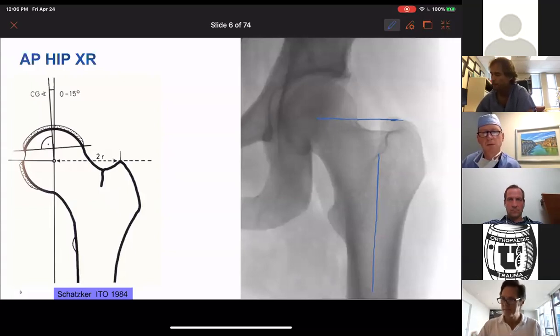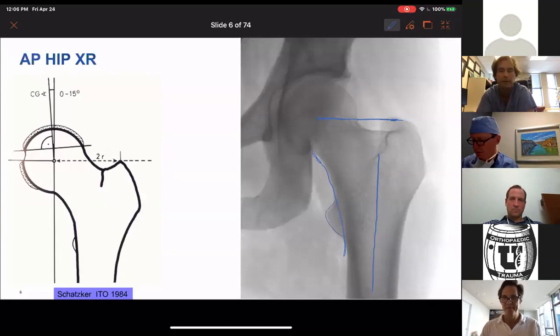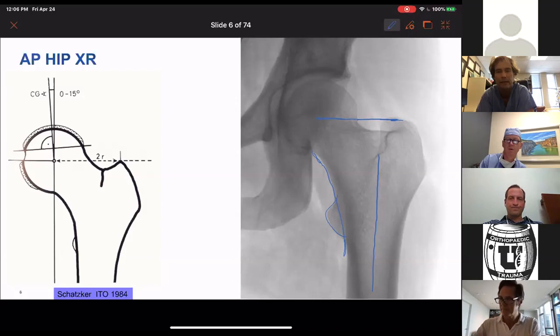Fourth, there is a particular relationship between the inferior aspect of the neck of the femur and the shaft. It is a smooth, unbroken curve. And the lesser trochanter, in varying degrees, will come out from that curve. And I say in varying degrees because there's wide variability in the population as to the size of the lesser trochanter. So in and of itself, it is not a measure of anteversion. I don't think you can use it just for that. Now, if you have a fracture of the proximal femur and it is attached to one or the other segment, it can help you with rotation, but the size of it in and of itself can't tell you whether someone has 5 degrees of anteversion or 40 degrees of anteversion.